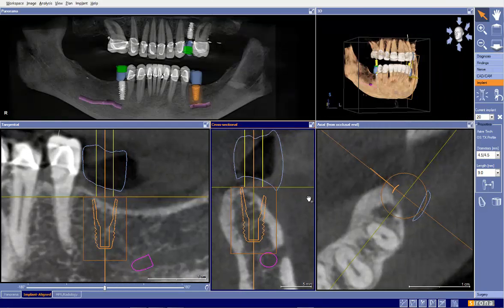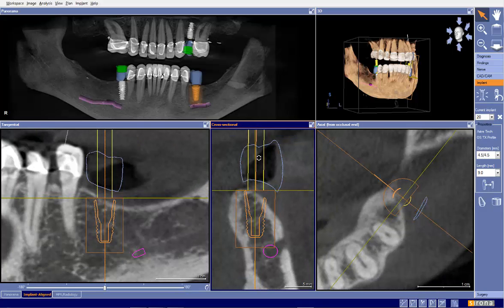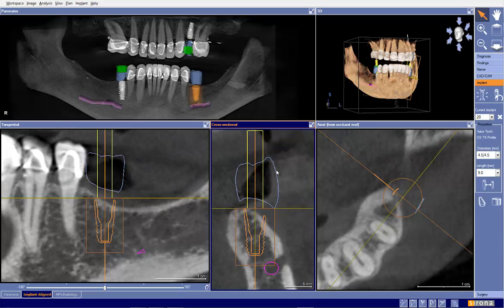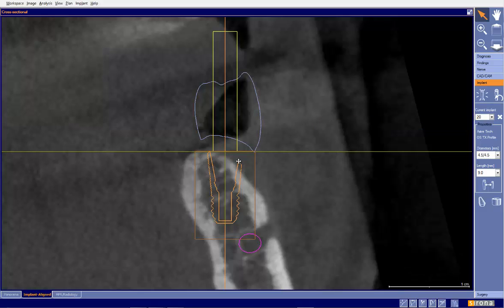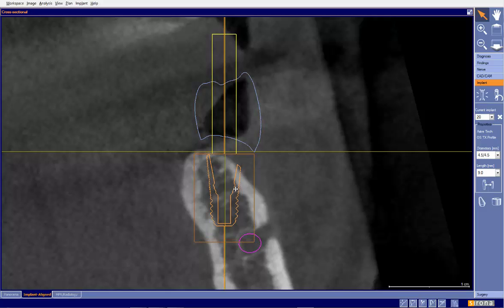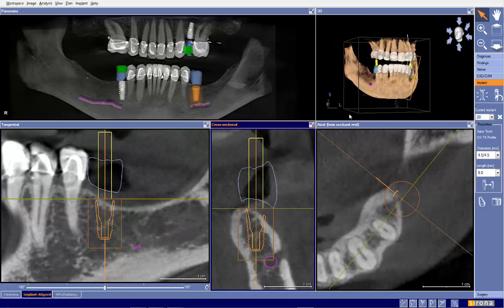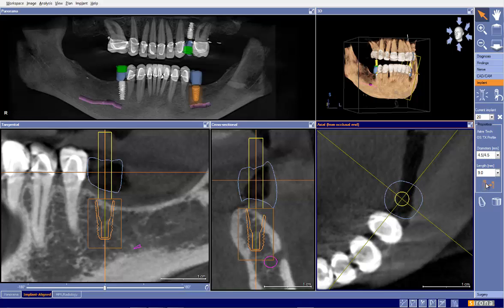And here we can see that maybe with this particular implant, we could do something along these lines right there and possibly avoid the need for a graft. Now this implant involves a little bit more work. There is definitely some learning curve with it, and you need to know what you're doing. But it is an option to avoid the graft.